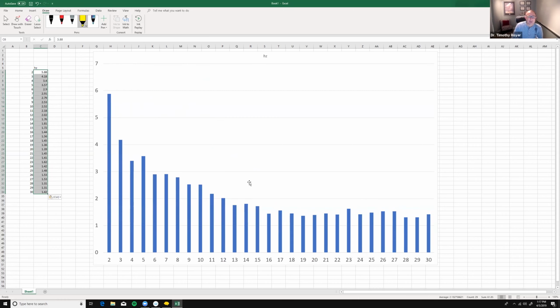So as we're looking at this, what I want to do is see how these are distributed. And you can see right out of the chute that there is a downward slope, but then at the end I kind of tail up a little bit. So instead of keeping the downward slope, I've got these high frequencies here. Now, if I go back and look at my high beta ratio, it's a little bit higher. It's a 1.8. That's because the frequencies stay the same, but the amplitudes of them over time are higher, and that's causing an issue.